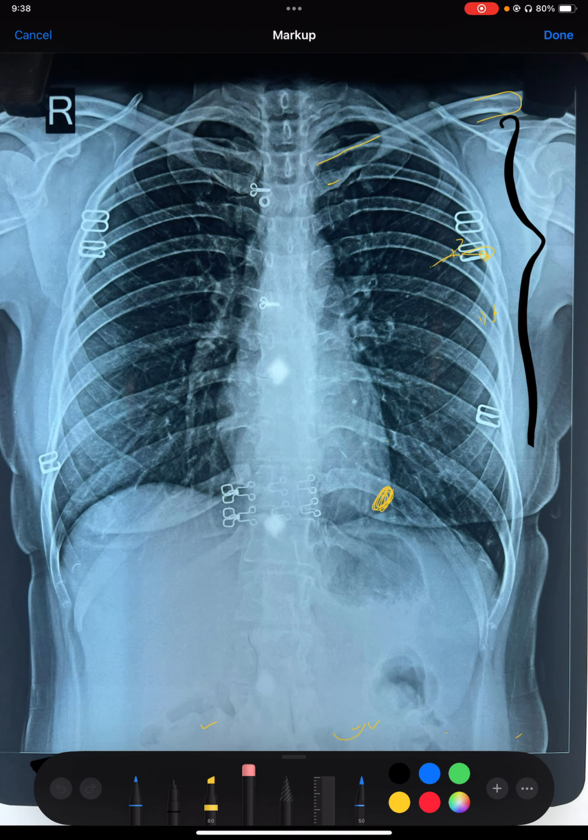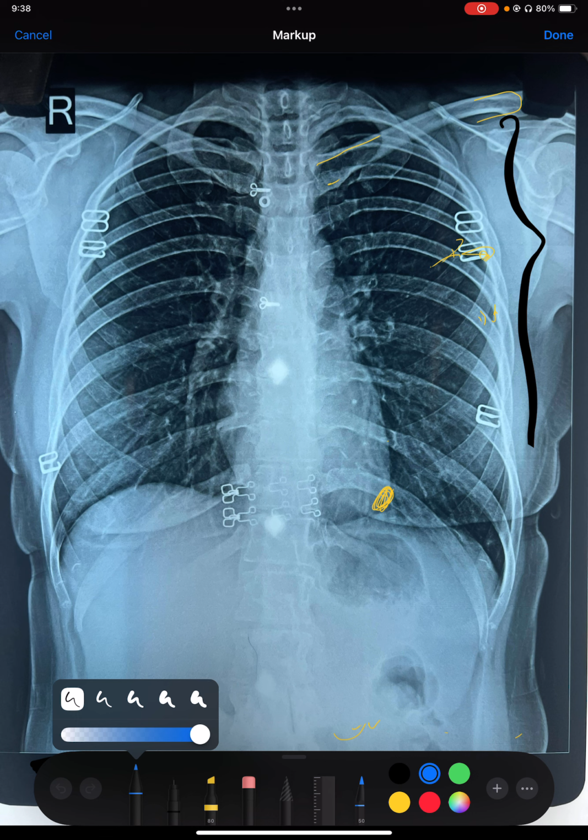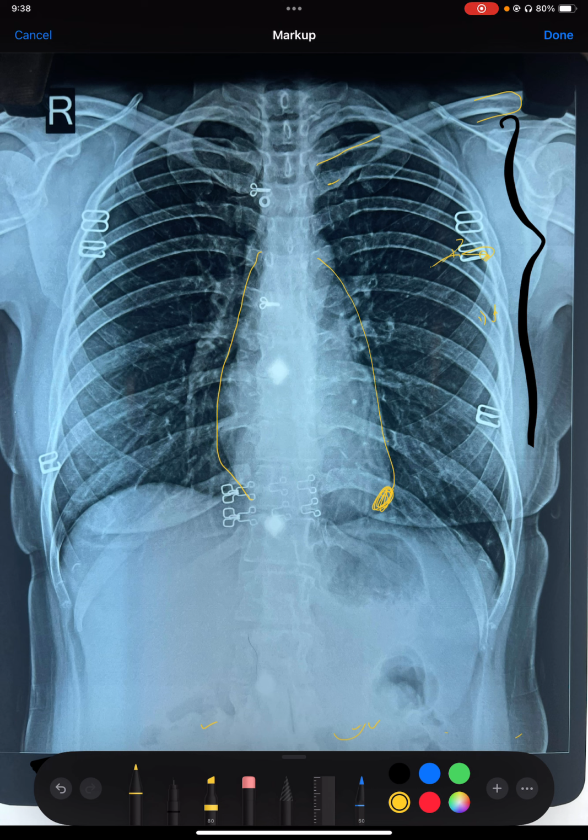This is not actually a normal X-ray. This is a very typical X-ray of a COPD patient. Here we can very clearly see the heart shadow and the pulmonary artery trunk. What we actually have is the small vasculature that arises from this hilum and goes to the periphery.